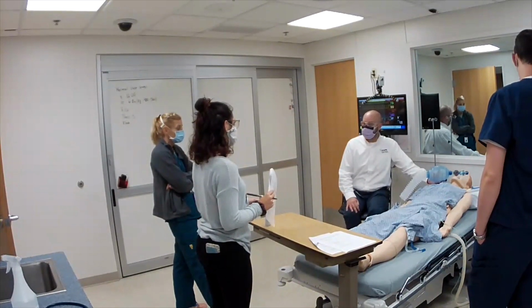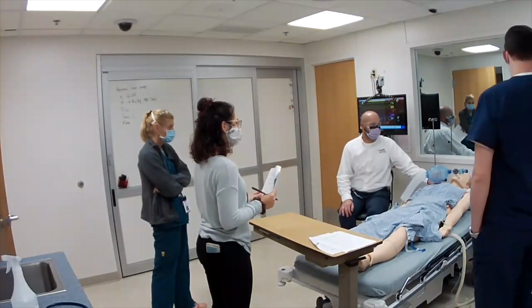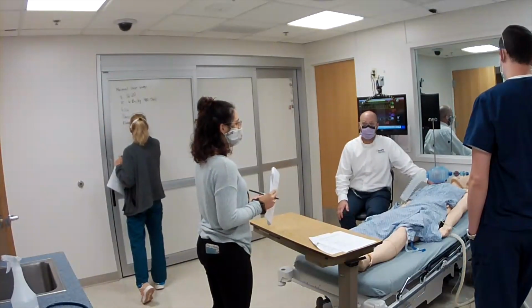What's the disadvantage of volume control, otherwise known as assist control, right? If there is such a thing as true assist control now, which probably isn't. You just have to monitor. And what happens if the patient triggers a breath?